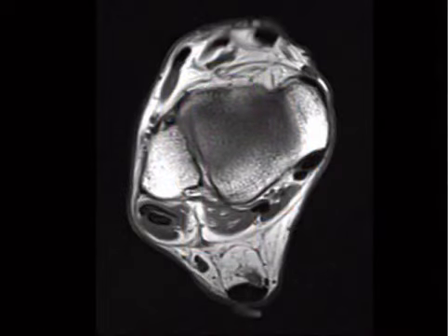So let's start off on the ankle. We touched on this briefly before. I'm just going to review the anatomy really fast. So Achilles tendon here, little guy next door is the plantaris. Here's the fibula. So these are our peroneal tendons, longus and brevis, and then we've got our extensor tendons here. The big one is the anterior tibialis. That's the only one that matters. The other ones nobody cares about.